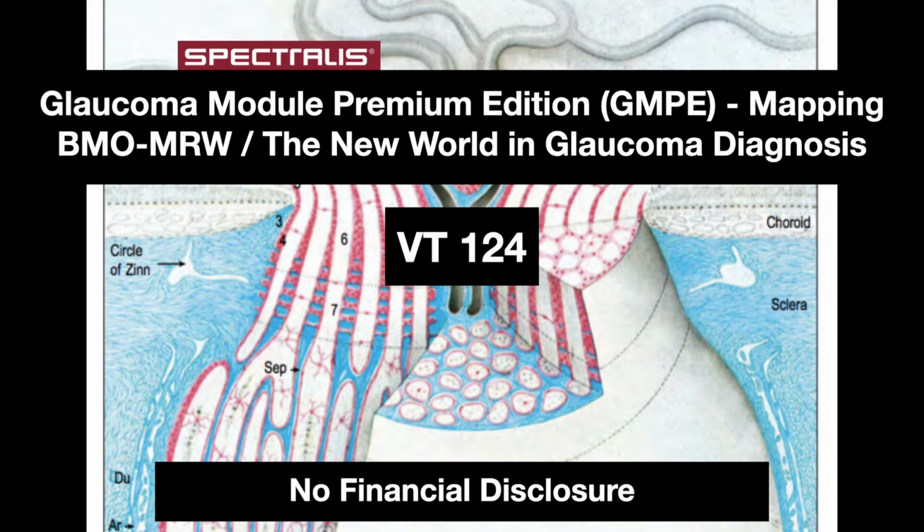Glaucoma Module Premium Edition, mapping Bruch's membrane opening minimum rim width. New world in glaucoma diagnosis.